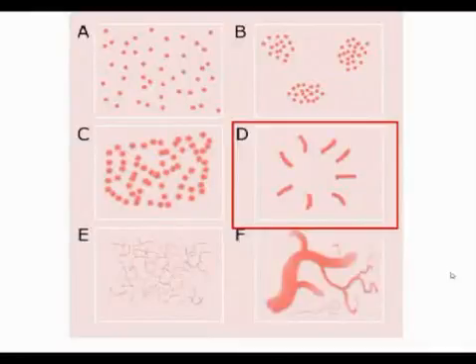D. We call this arrangement radial. It occurs with linear vessels. Mostly the vessels can be linear straight or looped or even serpentine. Doesn't matter. What's important is that the vessels are arranged in a radial way, do not cross the center, but the direction of the vessel goes from the periphery towards the center.